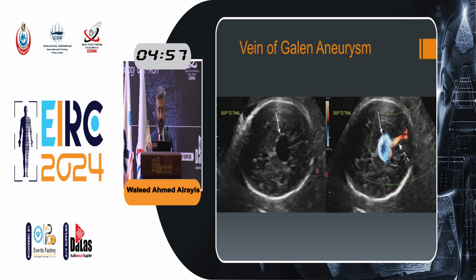Next case, in axial views, we have a cystic structure in the midline. When we apply the color Doppler, we can see a draining vein, which confirms the diagnosis of vein of Galen aneurysm.